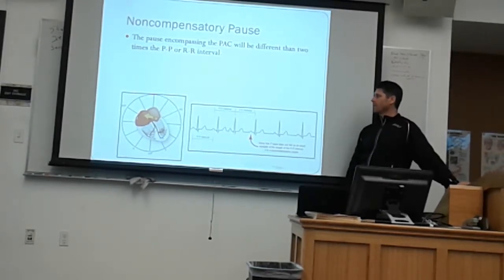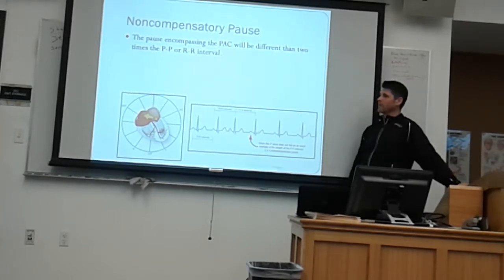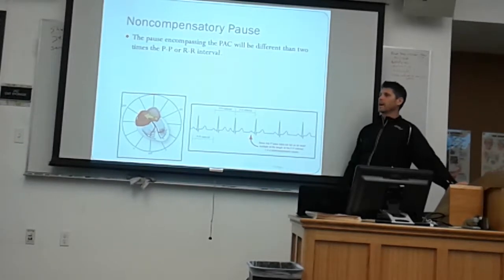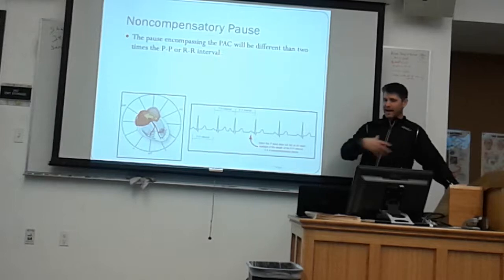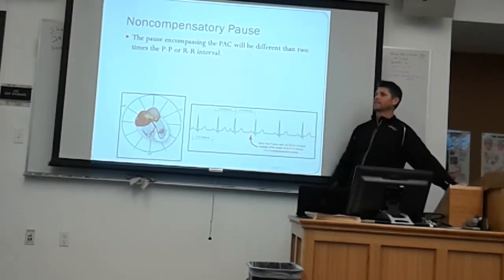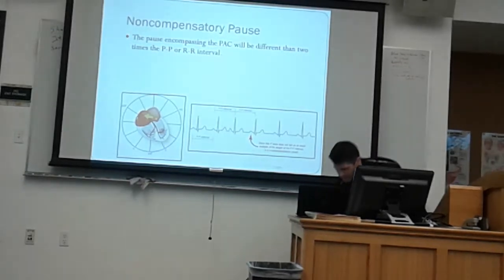Okay. In the end, does that really mean something terrible for the patient? Well, it depends. It depends on if the SA node had something that affected it, or if that goes along with other clinical correlations that you have as you're doing everything else. Right now, you're looking at isolated EKGs, so you don't have that clinical side to compare whether or not it's good or bad. So now I just want you to notice it.